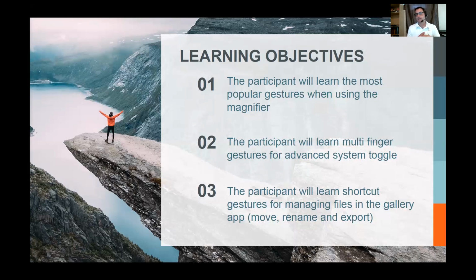Then the third learning objective, which I love because I had a Prodigy stop on my Connect 12, again because of a Prodigy build coming directly from R&D that wasn't tested, gave me a chance to show you the Reveal 16i, our other desktop CCTV, a foldable CCTV with a 16-inch screen. We can use all the same gestures that I showed you on the magnifier, the distance, and the gallery. And I showed you how to move, rename, and export a document from your gallery using the Reveal 16i. So that's how you can swap between the two devices.